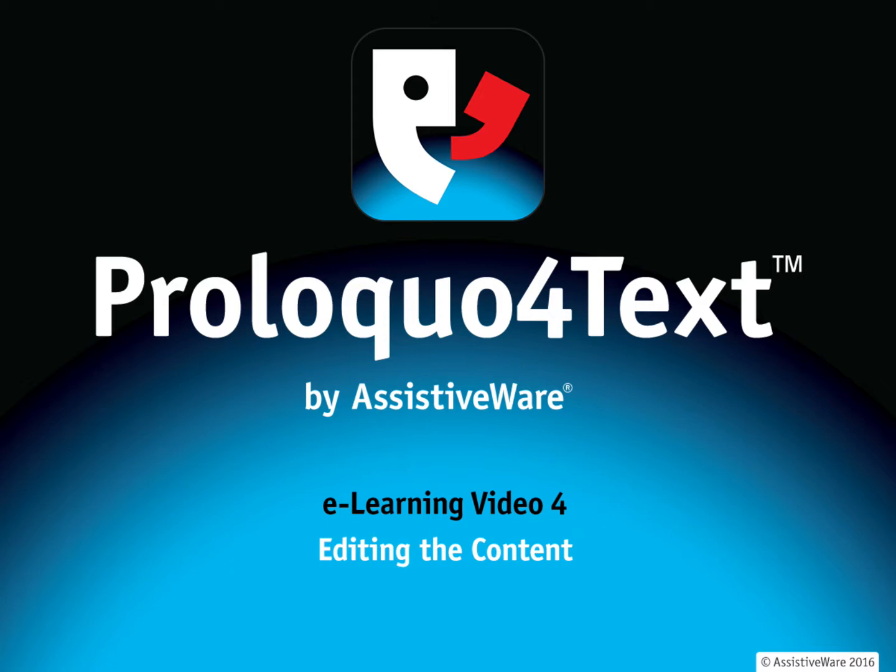So you've started using Proloquo4Text and now you want to make it suit your needs. This video will give you some tips and tricks for how you edit the messages and content in the quick blocks. This is vital so that Proloquo4Text has the things you need to say on it. Let's open the app now.